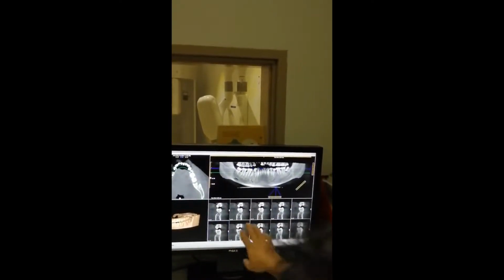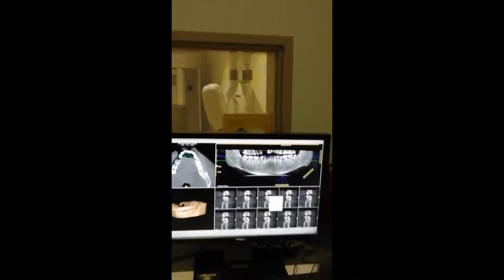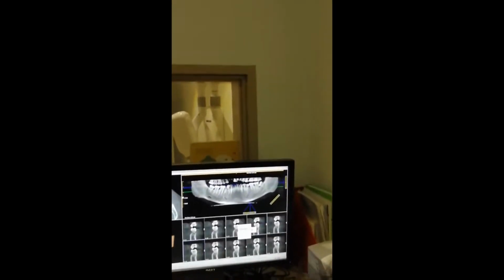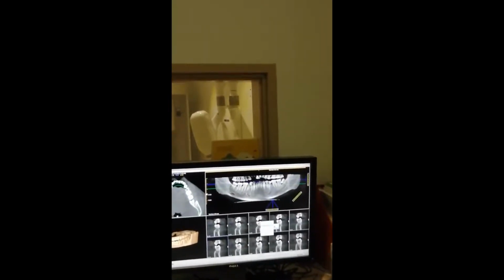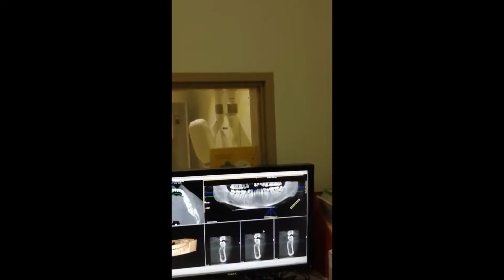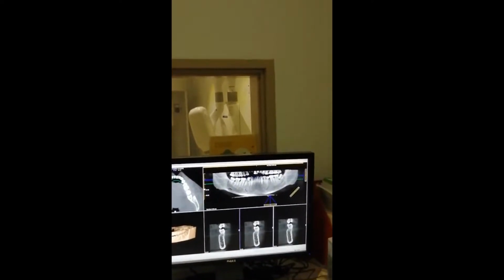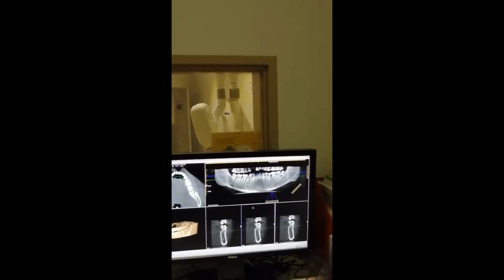So what I'll do is, there are several displays. I'll right click and there is a display format. I can adjust that. I can make it into 3:1 instead of 5:2. See, now only 3 has come. This is easy for us. There is not much.